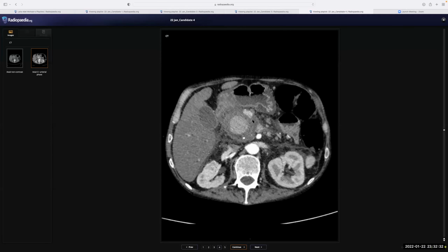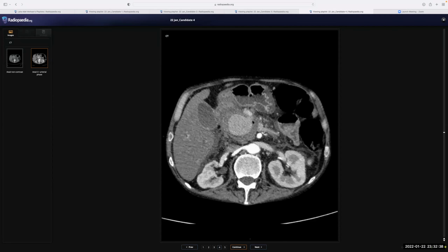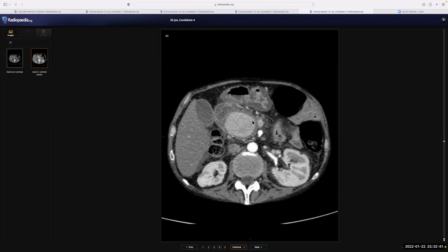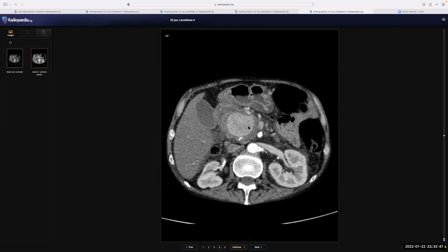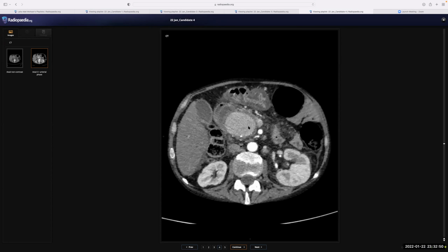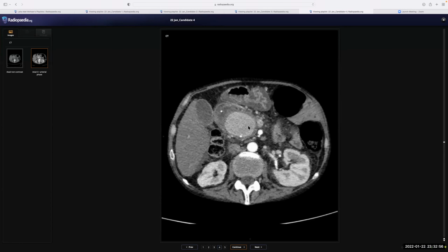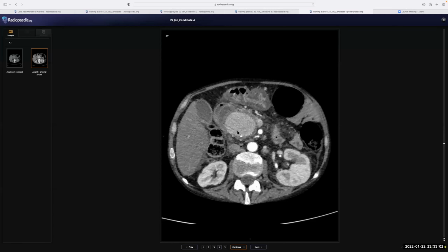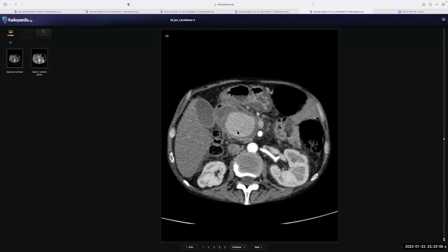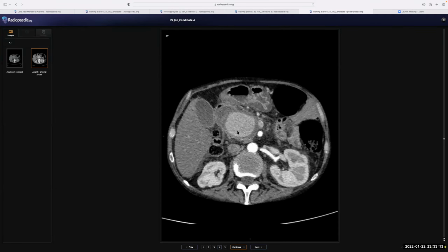I'm sorry, again, you said an aneurysm? As if it is arising from one of the arteries, and it can either be an aneurysm or can be a mass lesion of the pancreas. Any relation to the chronic pancreatitis? Can you please repeat the question, please? Any possibility, any relation to the chronic pancreatitis? Can be mass forming chronic pancreatitis, or it can be.